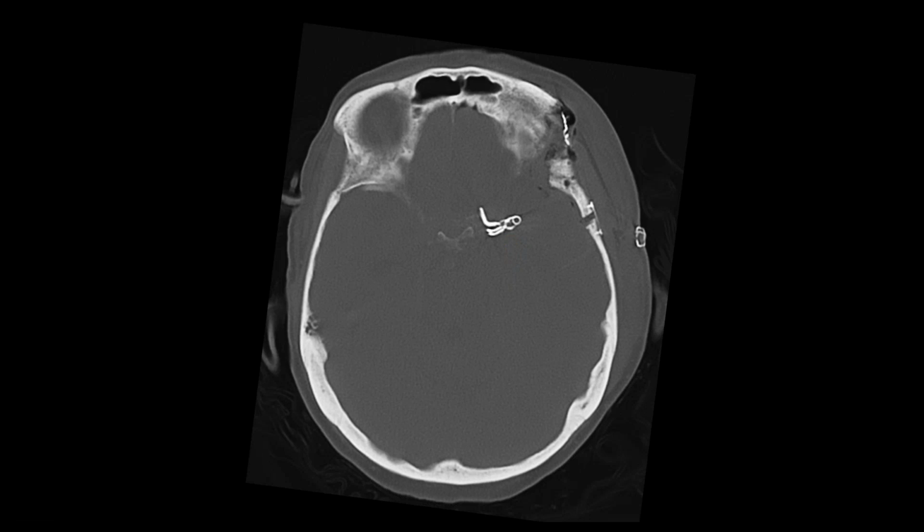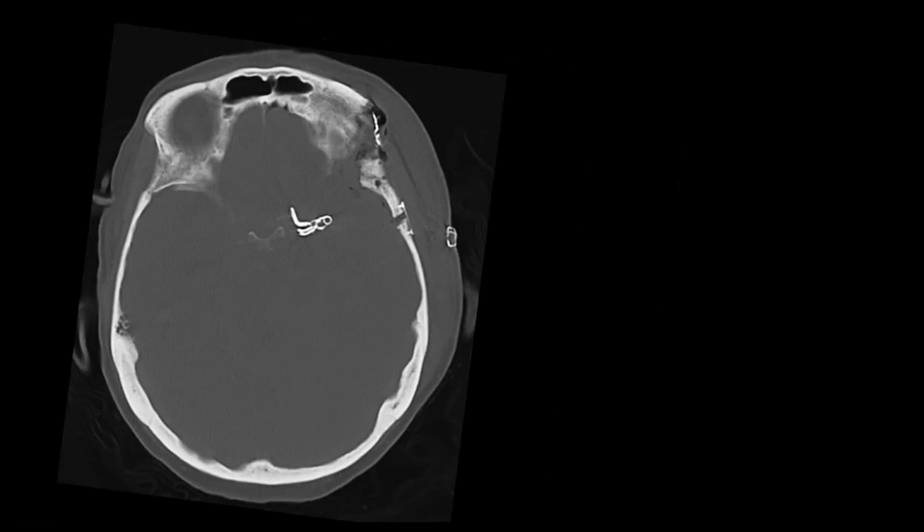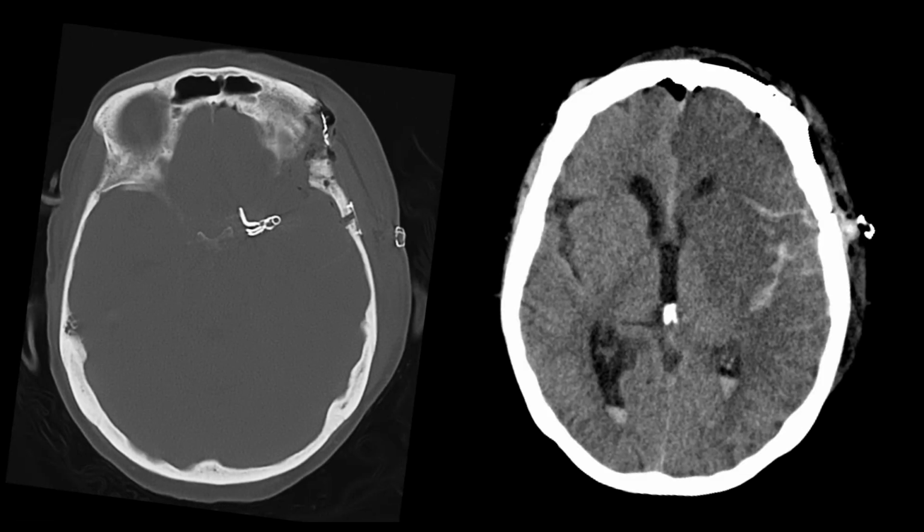was just this friable material that just fell apart, and his surgical bed quickly filled in with blood, and we had a very bad postoperative experience on this patient with this diffuse ischemia, low density we see here on the CT, with blood products and blood within the ventricles themselves, because this carotid just fell apart.